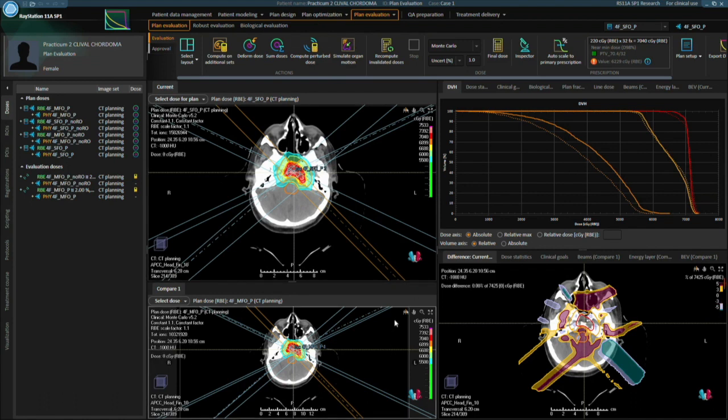So we have a clear evaluation there. It's going to discuss in detail now how we evaluate our plan after planning. Robust evaluation is going to come, where we check whether any changes, if we perturb it, will change anything.